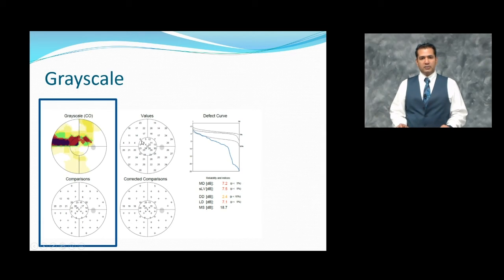From the raw data, you get an understanding of what the patient responses are, and when the raw data is compared to their age-matched control, you get the comparisons plot. And from this comparisons plot, they generate the grayscale comparison that shows, compared to their age-matched normal, what level of defect this person has.